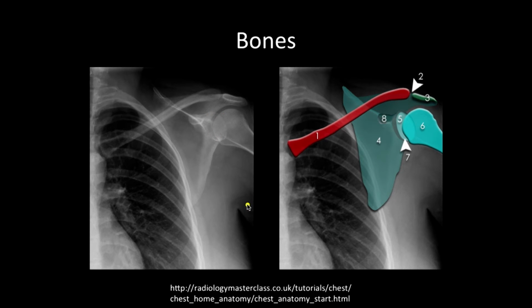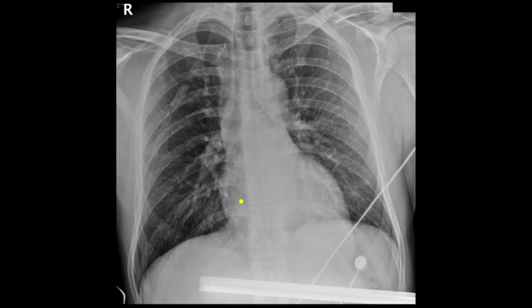And have you seen fractures of all of these structures on X-rays before? You may not necessarily see all of them on a chest X-ray, but certainly I've seen different structures, and a lot of them are very readily apparent. If a patient has major trauma, you can see at least some of the fractures on the chest X-ray. Great, so let's take a look at some examples.